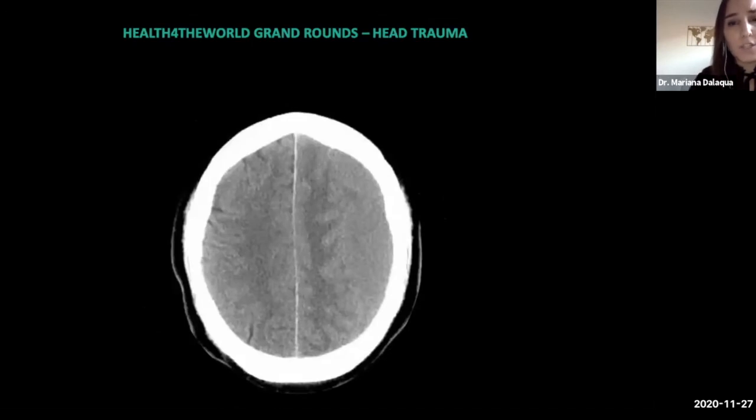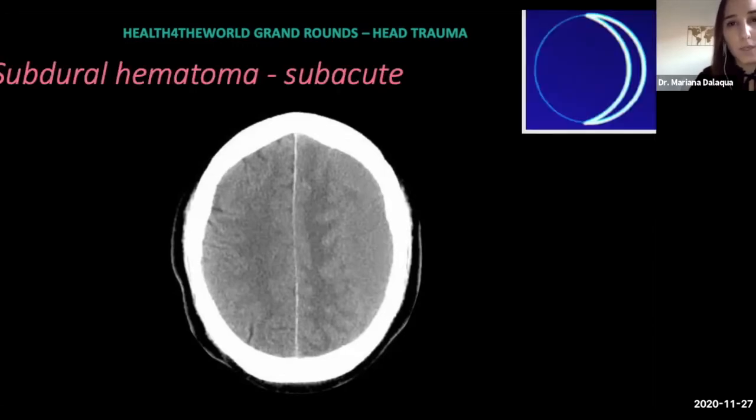Going on for a different patient now, we see on the left that there is something here that occupies space and has the same density as the cortex. And sometimes it can be missed by less experienced radiologists, mostly if it's bilateral, that it can happen bilaterally, less experienced radiologists may find it normal or may misunderstand what's going on. So here we have an isodense subdural hematoma in a subacute phase, okay? So we should not let this pass. We should not forget to search for it. We don't have a cortex that would be thick like this. We should always consider there's something else.